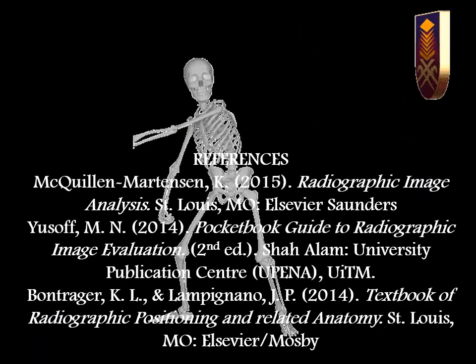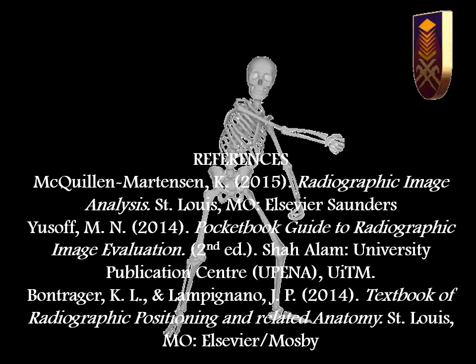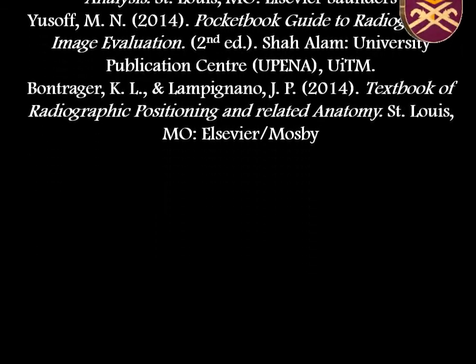Yay, great! Now we have successfully evaluated the image using the PACEMAN method. I hope that this video is beneficial to help you in evaluating radiographic images of oblique ribs.